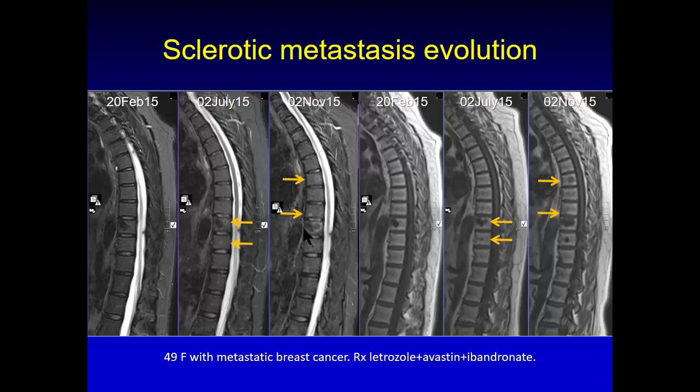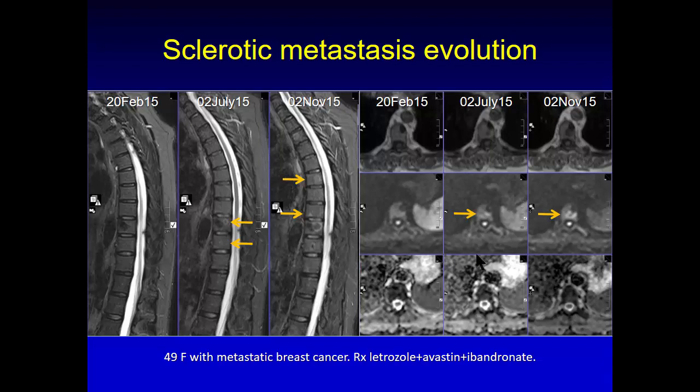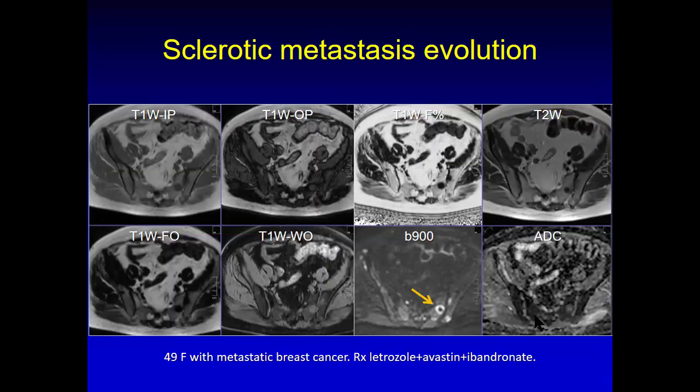And that's why you see this. And in fact, on the axial images, you see a similar thing. Here it is, that this metastasis here is activating. You can see eventually develops a ring. So in the center here is mineralization. Here is an area of osteolysis where the tumor is growing.